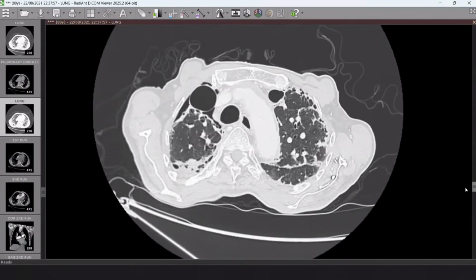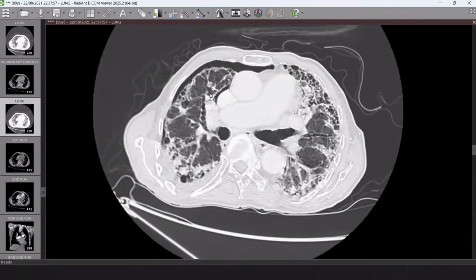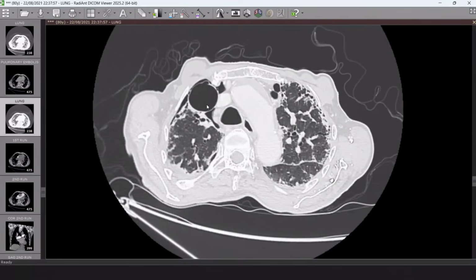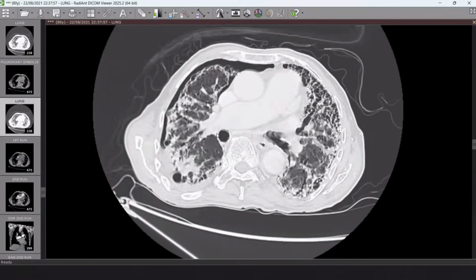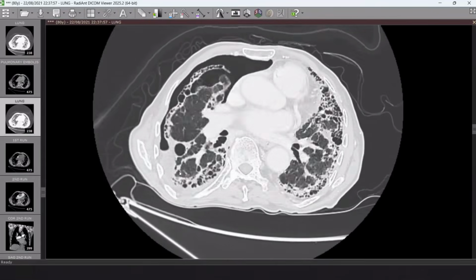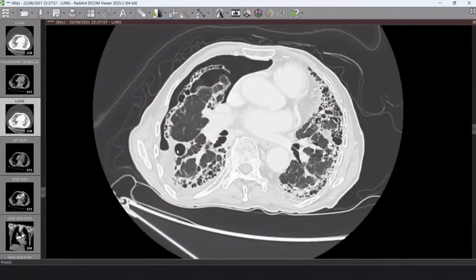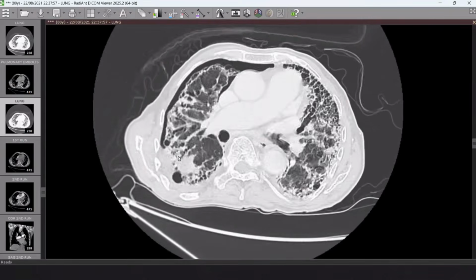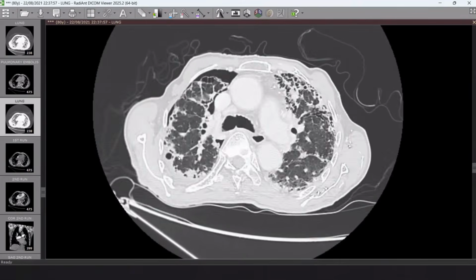Rupture of the cystic honeycombing. Okay, rupture of the cystic spaces. Okay, can be one of the explanations, but can you give me another explanation? By the way, this one is hydropneumothorax. It's not only pneumothorax, okay? But can you give me an explanation for the pneumothorax in any patient of UIP?